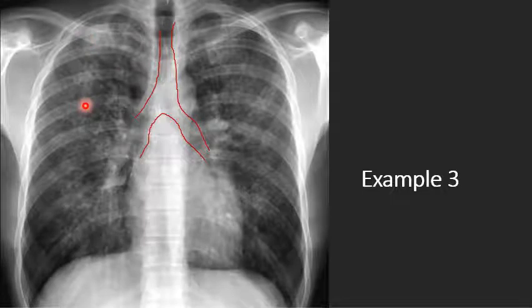And then going into our B, which I skipped, we see this pattern of just diffuse generalized hyperopacities. And you see the pleural lines to the extremis all the way around. Doesn't look like there's pneumothorax going on. Costophrenic angle is not blunted, but we do see this kind of, they call it ground glass appearance. It's just like specks of glass and sand in the chest. So no lines, tubes, or drains.